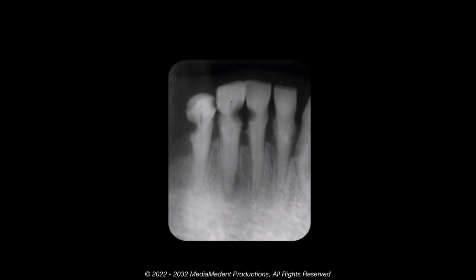Caries in the dentin of the root, also called root, cervical, or cemental caries, may occur in patients with exposed root surfaces resulting from alveolar bone loss. Radiographically, this lesion appears on the proximal surfaces in cervical areas as a radiolucent and saucer-shaped defect. The arrow in this radiograph points to such a lesion on the distal root surface of the mandibular right lateral incisor. There is also a cervical lesion on the mesial of the mandibular right canine.